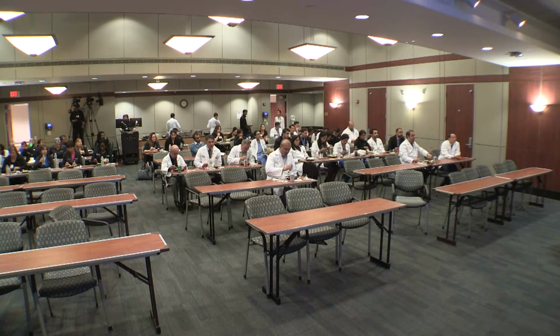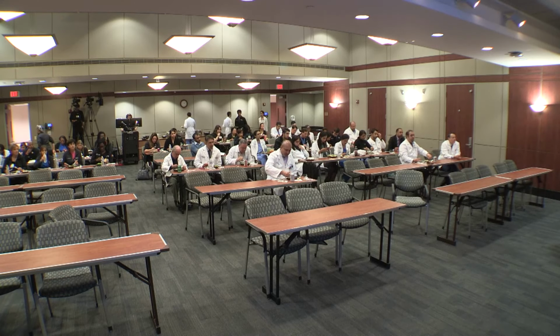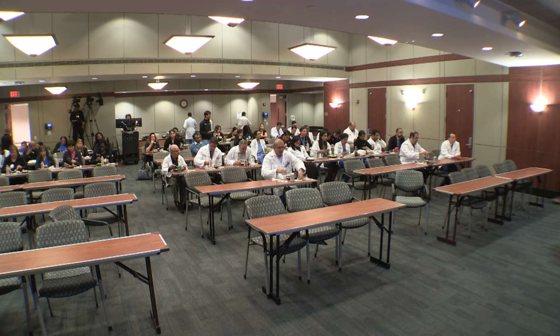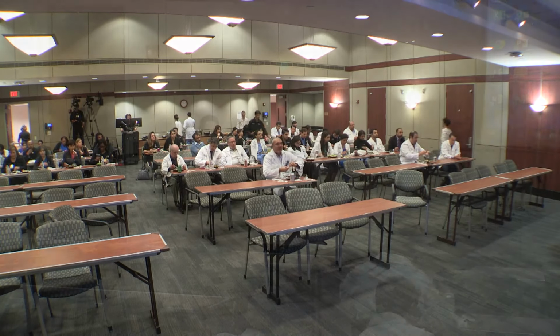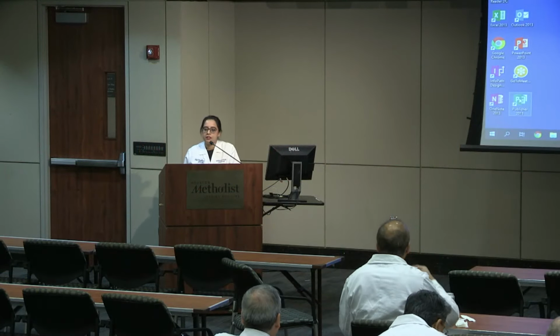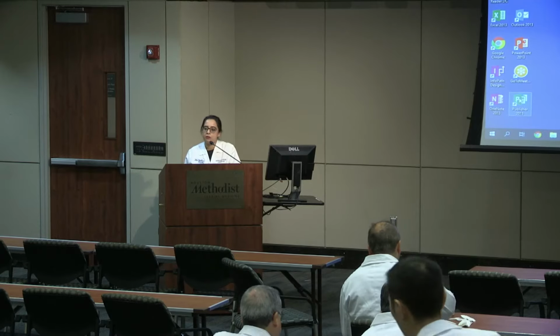And then, of course, a subject that's very close to my heart is aortic regurgitation, and that's something we're working on. So the idea is to talk about how we can better quantify aortic regurgitation. Particularly now, when I presented this information last year, we didn't have clinical outcomes that correlated with echo parameters.